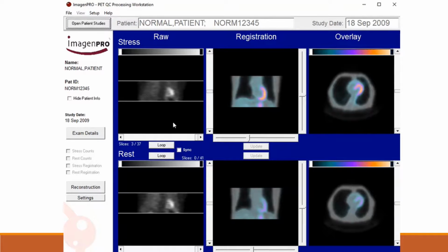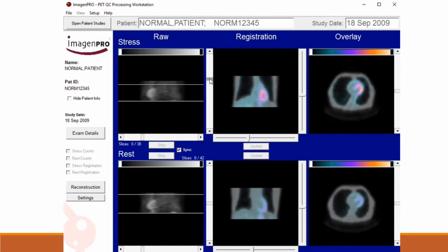During the reconstruction, the technologist should review the rotating projection datasets for any camera defects, non-cardiac uptake, etc., remembering in PET that patient motion cannot be assessed by reviewing the rotating images. We then select a good coronal view for misregistration correction. The lower slider is used to correct for any misregistration. We're going to use this function to create a fictitious image artifact.